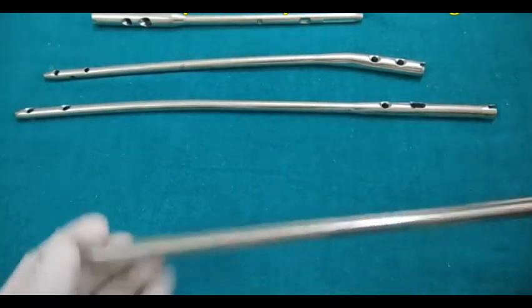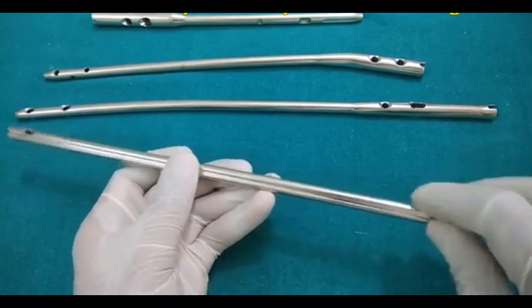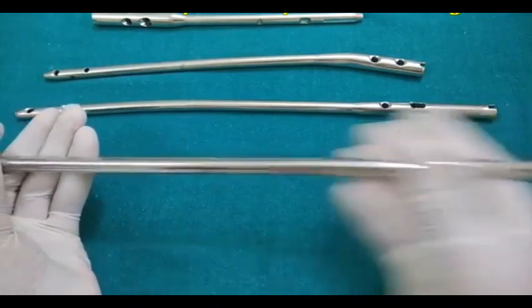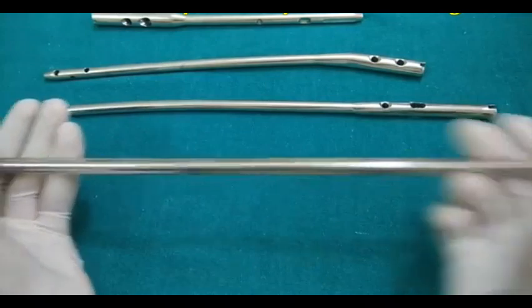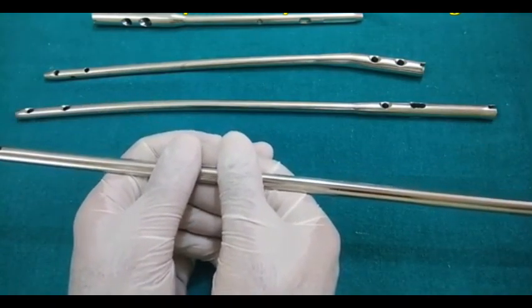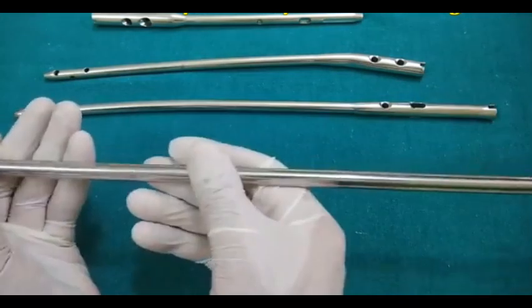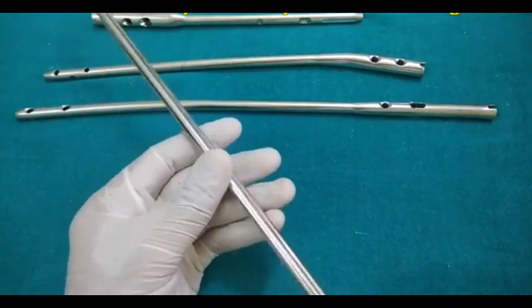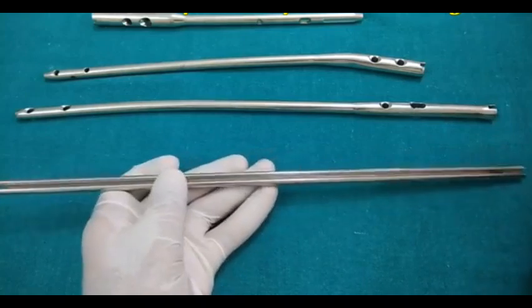Now the basic mechanism or the basic principle of K nail is 3-point fixation. When we insert this in the femur, one at the lower end, and in the middle is the isthmus. So it provides the fixation at 3 points, 2 at the ends and 1 at the isthmus. The isthmus is the narrowest portion of the medullary canal of the femur or any other bone. However, it does not provide any rotational stability. So it fails to provide the rotational stability, and that's why the interlocking nails came into the picture.